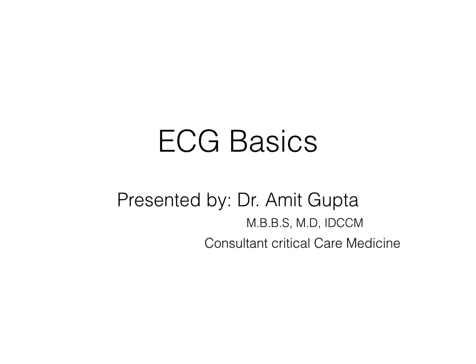Today we will discuss ECG. First we will learn the basics of ECG, then we will try to diagnose different kinds of cardiac disorders using ECG.